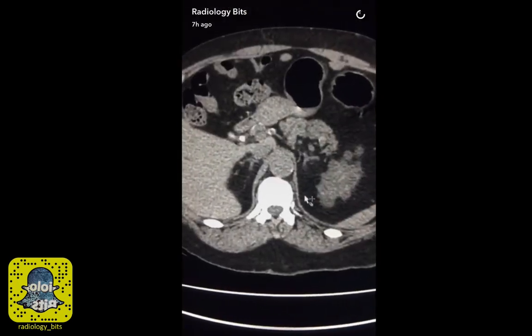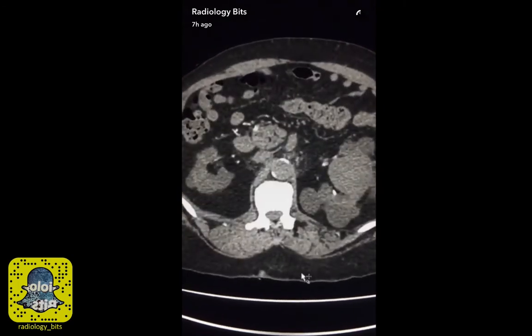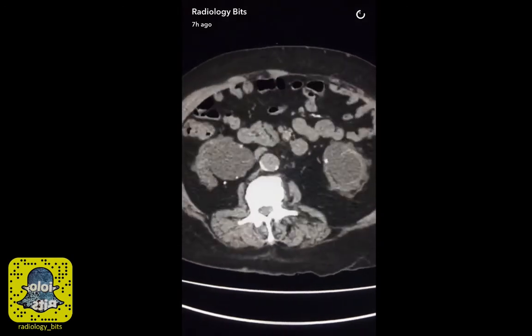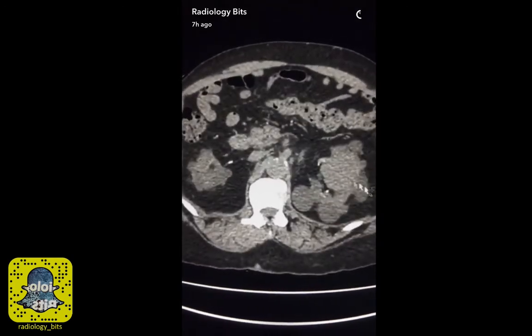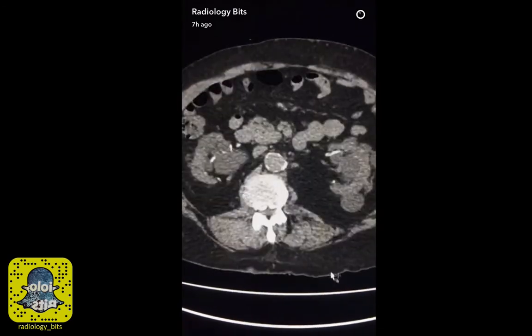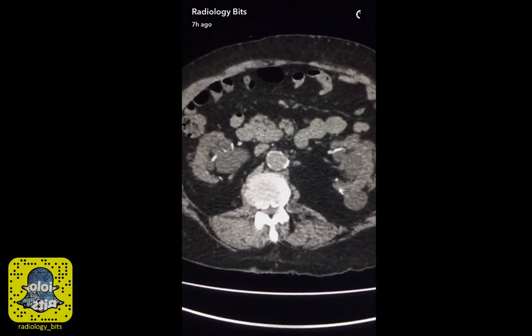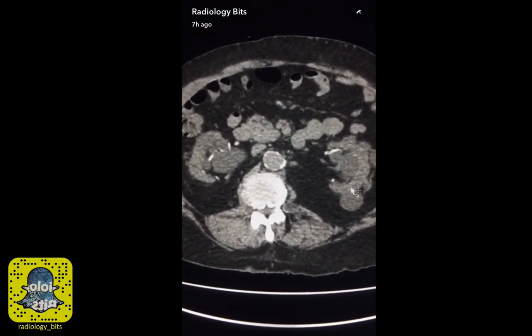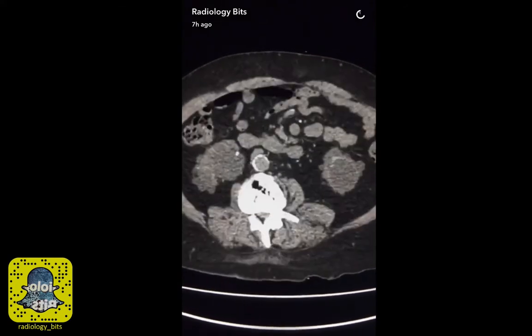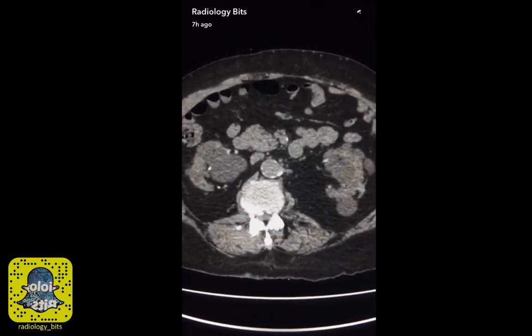Now, why did the patient have stents placed in stenosed left internal jugular and subclavian veins? You could complete the story by looking at the upper abdomen, where you have multiple bilateral renal cysts actually superimposed on thin renal parenchyma. Both features are consistent with long-standing chronic renal failure. So with that, you have thinning of the renal parenchyma and development of cysts over time.